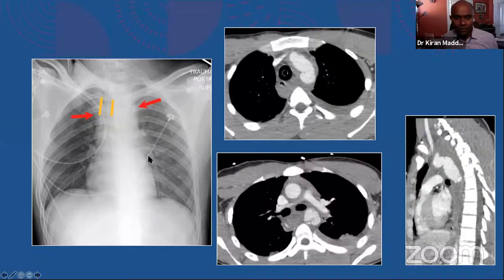comparison. So how exactly this works is when you see such a patient, and when you know that this is from a trauma, especially from a motor vehicle collision, the patient having chest pain or not chest pain, you have to alert the clinician that he needs, say, CT immediately. So this is a CT of a patient.